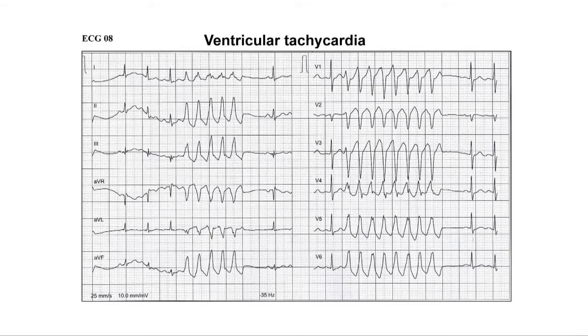And this does generally indicate some abnormality with the left ventricle, either a cardiomyopathy, a previous myocardial infarction, coronary artery disease, that sort of thing. So yeah, it is worth looking into a bit further.